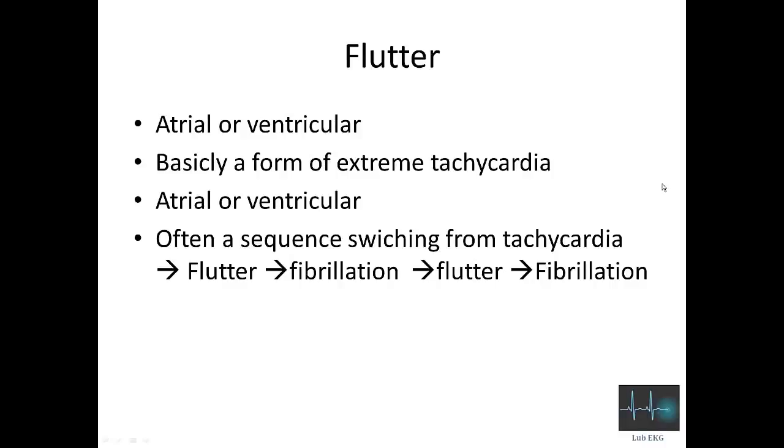Then you have flutter. Flutter is basically a form of extreme tachycardia. It can either be atrial or ventricular, but these are still just a form of tachycardia. You will often see that flutter changes. They switch from tachycardia to flutter to fibrillation to flutter to fibrillation.